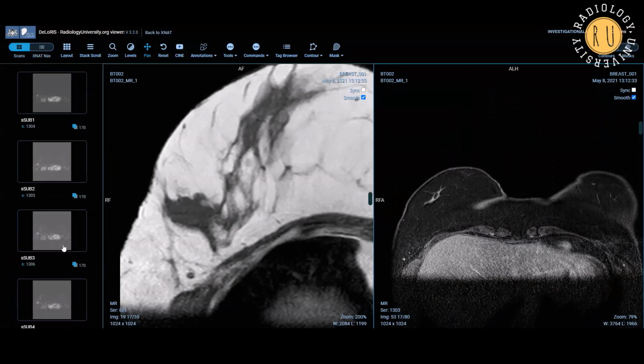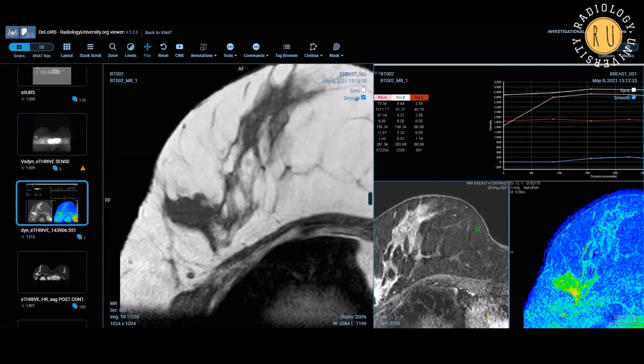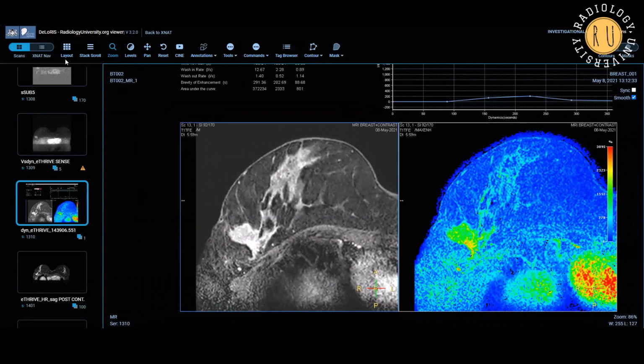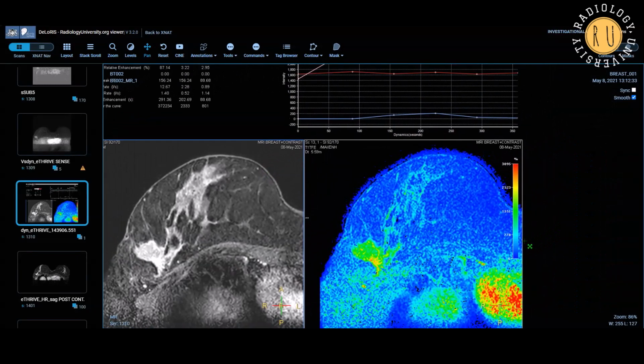And then finally, coming to the dynamic scan. In the dynamic scan, it's a bit like in the brain. You will always have this scale on one side, going from blue to red. You see the heart and everything, the liver also, shows moderate perfusion.